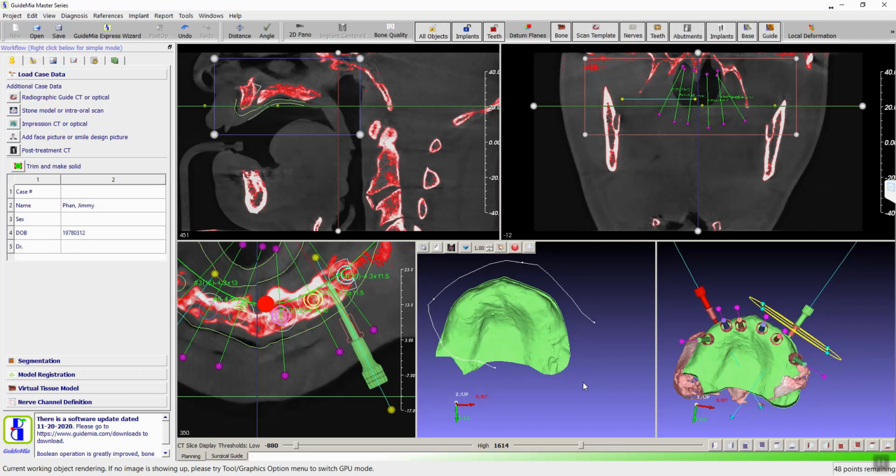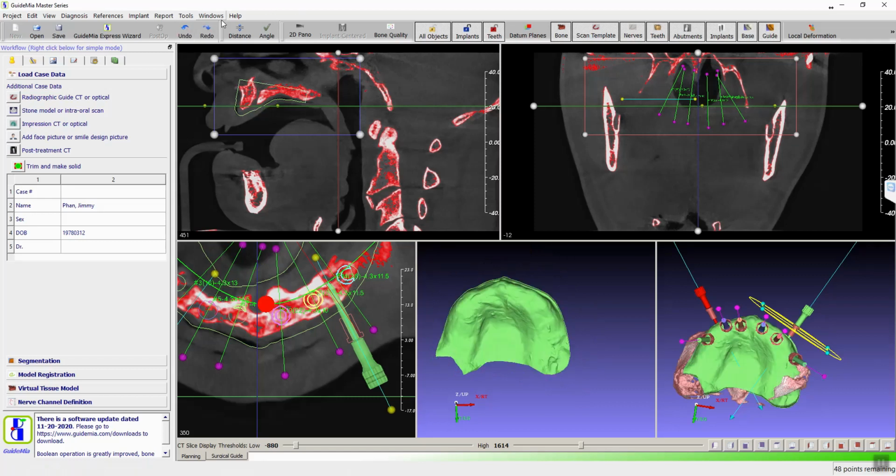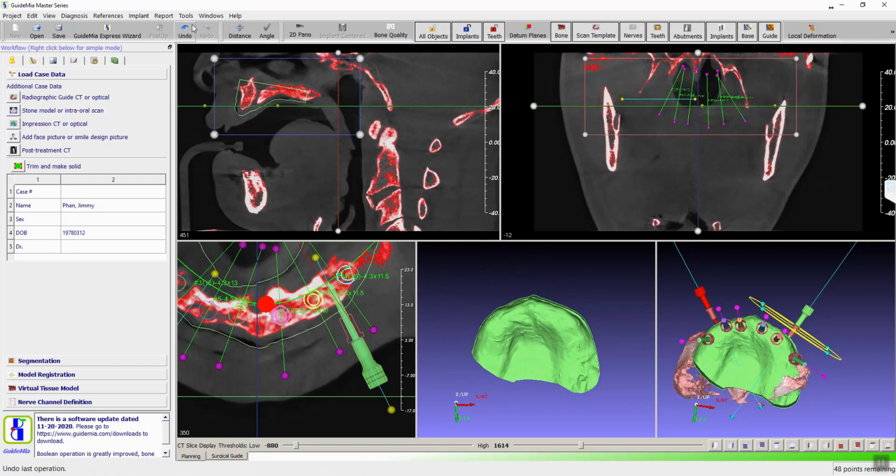So I'll go like that. It's going to get rid of this piece. Oh, sorry, I used the wrong tool. I have to select the aerial. I did that four times earlier. Okay, so I'm going to select clockwise, this area, counterclockwise. Actually, for this tool, it doesn't matter. It's just that we have two tools, to keep or to get rid of that. I have one step, then I'm going to do the second thing.